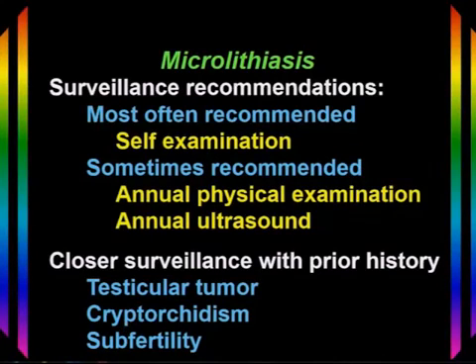So if microlithiasis is encountered at an ultrasound, what do you recommend to the patient? Well, most often it's recommended that the patient do self-examination to assess for the development of a tumor. Because although tumors are 8 times more common in patients with microlithiasis than in those without, the risk of cancer is still quite low. A few have recommended annual physical exam or an annual ultrasound.